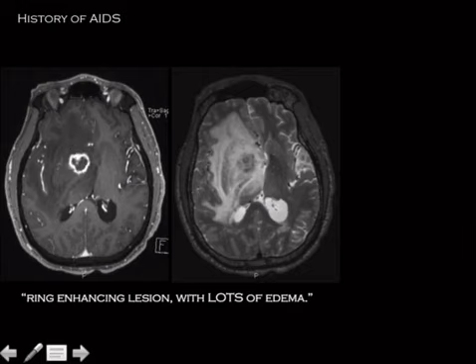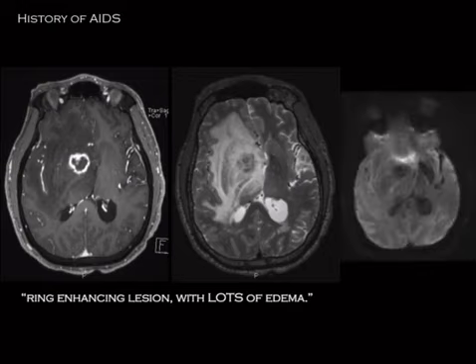It's going to be C-shaped, an open ring shaped. What else restricts diffusion? Abscess restricts diffusion. Classically, bacterial abscess. That's going to be an important thing to remember. Certain infections will restrict diffusion. Some stuff that I'll show later on. Stroke obviously restricts diffusion. Okay, so let's look. It's not restricting diffusion. So how is that helpful? Okay, so it's not a tumor, well, not a hypercellular tumor. It's not a stroke. It's probably not a hematoma.